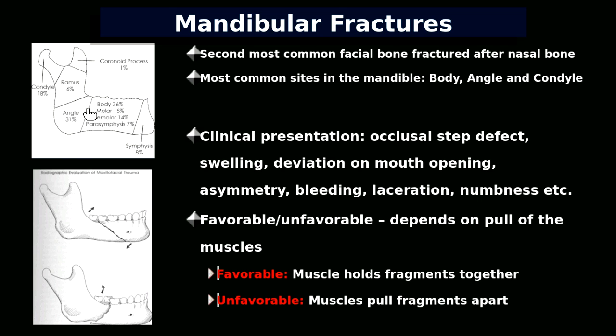So based on these percentages, you can see, just know that there is a fracture. This percentage and everything I will not ask in the exam. So just know this thing comes. Always make sure you compare it with the other side too.